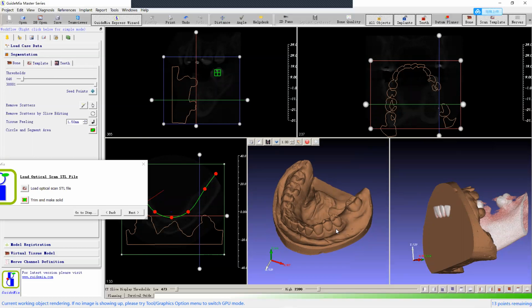case preparation, about scanning protocols for implant guided surgery. So in general, when we are doing this treatment planning, for clinical reasons and for technical reasons to design surgical guides, for both aspects, we need a full anatomy of the patient, meaning you want the patient's bone structure, the nerve structure, the soft tissue, the teeth, and the occlusion too.